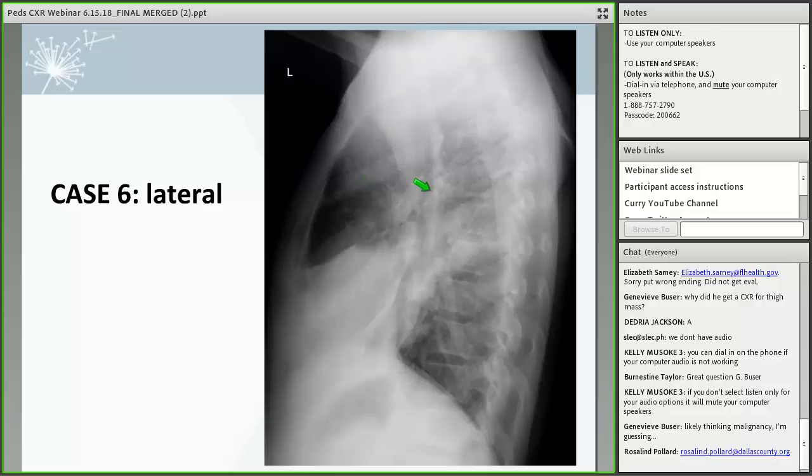The trachea is coming down. Normally you can see the right upper bronchus. To the right of that, you should see the right pulmonary artery and the left pulmonary artery. Now this is way too dense for pulmonary artery. So again, this is consistent with adenopathy in both hilar regions. And then anteriorly, you can actually see consolidation overlying the region of the lingula on the left lung, and the right middle lobe in the right lung, as well as some opacity in the lower lobe as well.